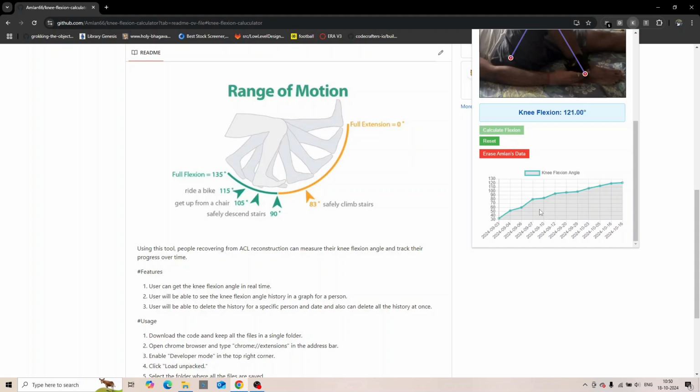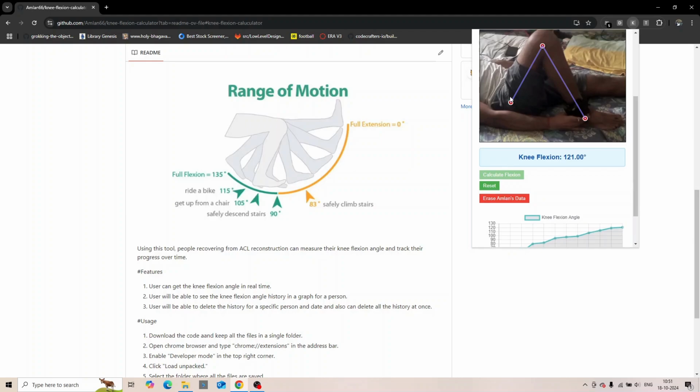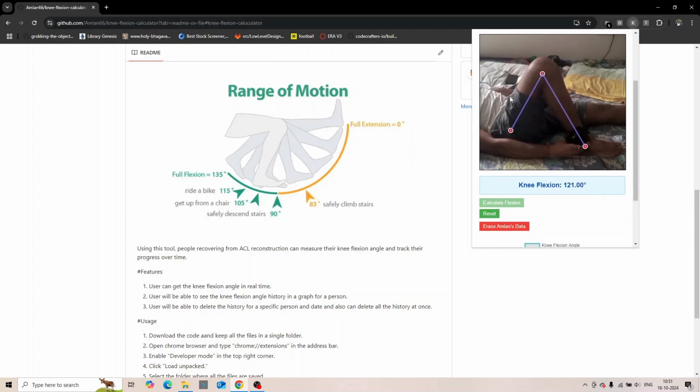So there are a few things that we need to take into consideration for this. Yes, we are manually selecting the points, and it might be a little bit wrong, but it does give us an idea where the range of our angle lies. To mitigate this, there is also a wonderful library developed by Google called PoseNet, but because of Chrome's CSP, I couldn't include that.